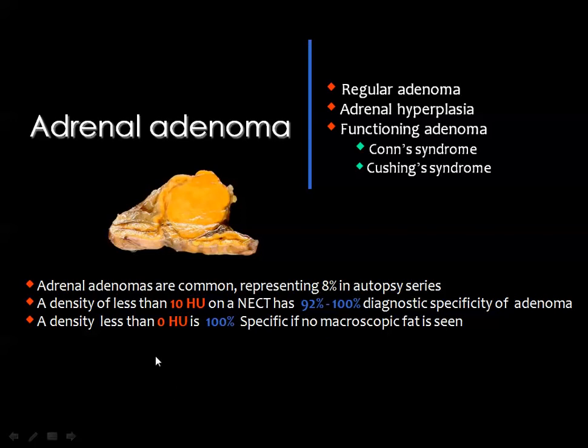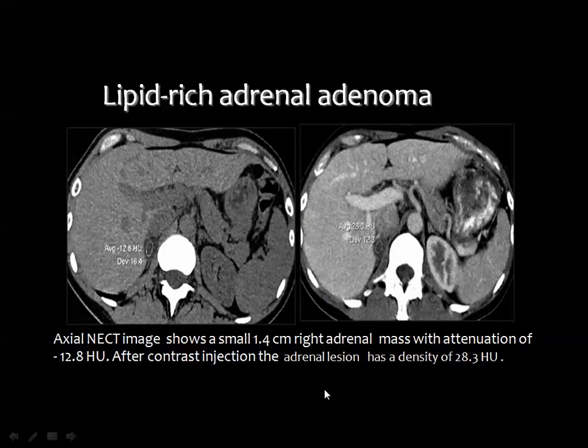And if the density is in the range of -10, below 0 or around 0, this is almost specific for the microscopic fat. Then, in order to diagnose the lipid-rich adenoma, which is the well-known form of the adenoma, you have the pre-contrast CT scan, then you inject contrast media, then you have a delayed 10-minute scan after injection of contrast.